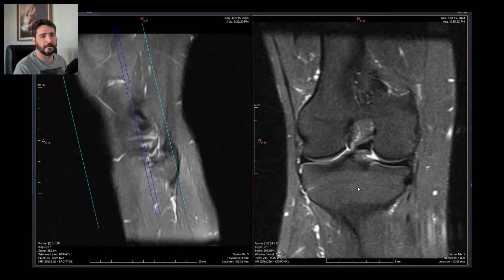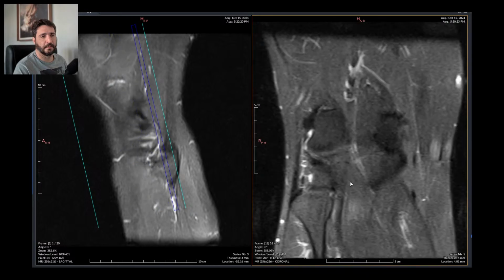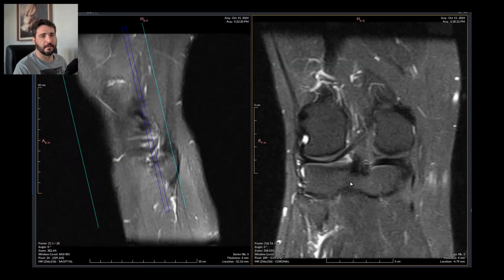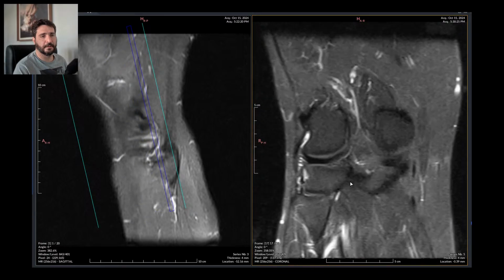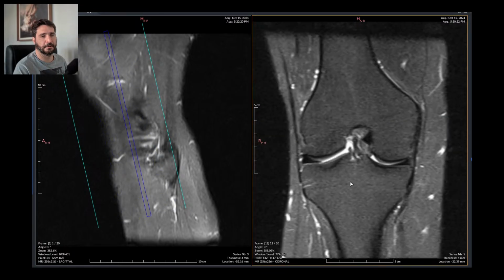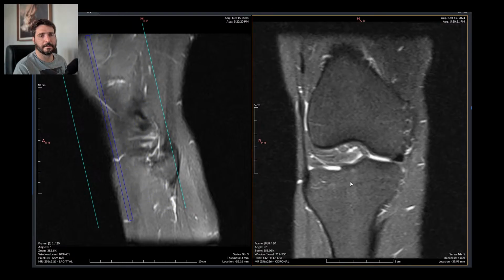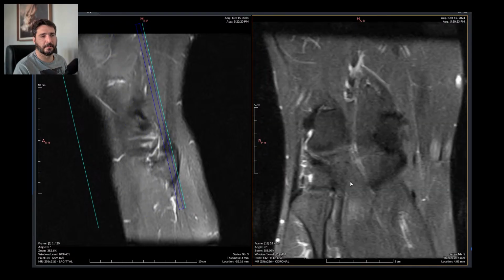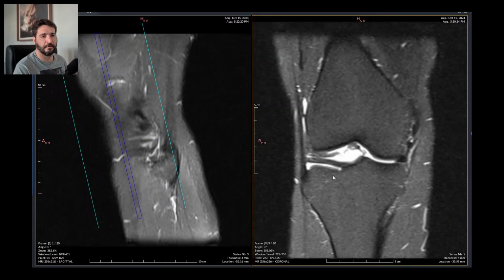Why? Just because it makes a great part of the knee joint? Come on, no need to image the entire knee joint in a knee joint exam. Just the parts the technician feels like imaging.